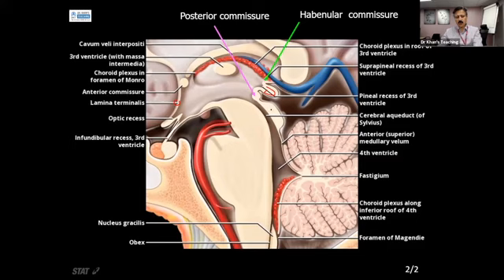Now come to the brainstem. So please remember, we are at the midline of the brainstem. So from here to here is what we call the tegmentum, and this is the tectal plate, and if we go parasagittal, then you will see the superior colliculus and inferior colliculus, which are a paired structure, but they will be right and left. This is a midline sequence.